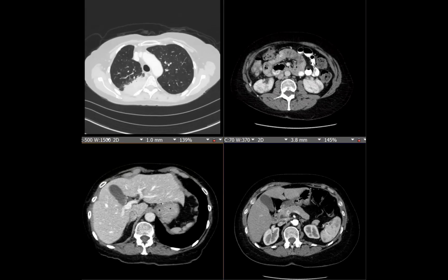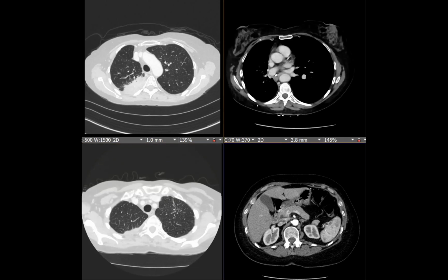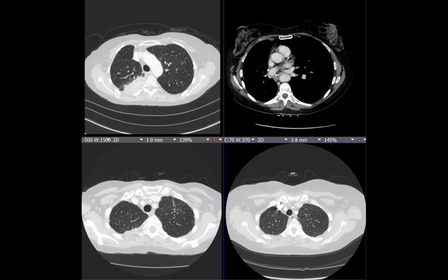And if I can convince you, this patient has had that as well. And this upper lobe opacity has been getting worse over time. It wasn't really there on the initial exam, and it's developed and is progressing.